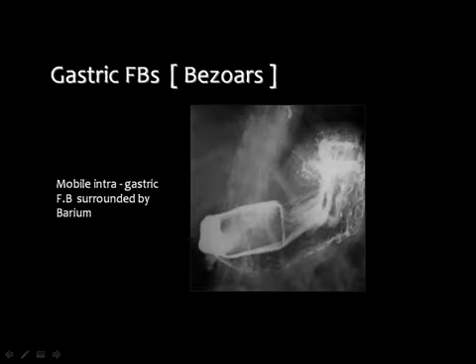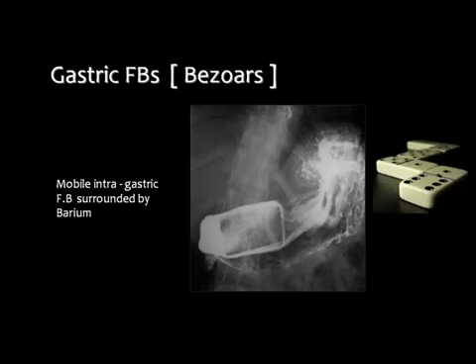Then foreign bodies in the stomach are diagnosed by filling defects that are mobile inside the stomach. And this is an example of a foreign body in the stomach. Can you predict the nature of this foreign body? Okay, this is the foreign body.